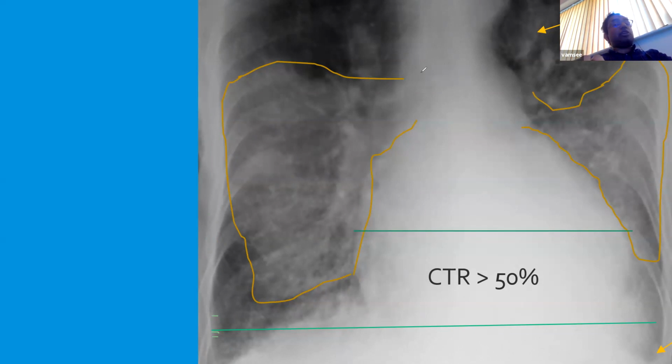So, and it makes you sound really smart. So, oh, I can see pathognomonic of this. If you can't, don't worry about it. It is a subtle sign. Just make note of all the other features that will probably give it away. Okay, so moving on to the next case.